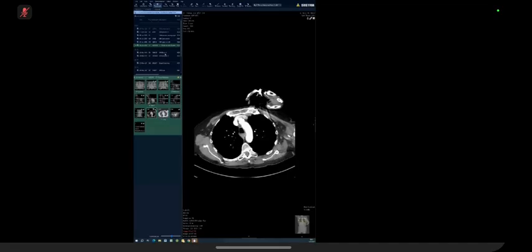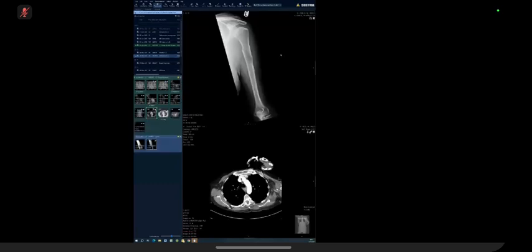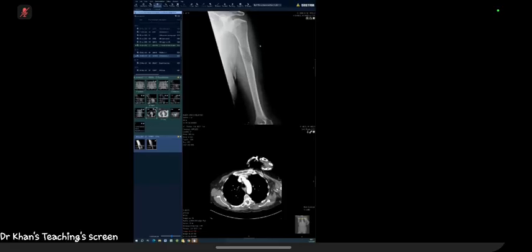We're going to go back to the bone first. Nobody's going to show you a plain fracture in a Viva unless there was something special about the fracture management or the location of the fracture. It's a typical mid bone fracture. It's not going to be a simple fracture. If you pick the fracture straight away, you immediately need to start thinking about pathological fracture. They're not showing you a fracture, they're showing you something about the fracture they want you to talk about.